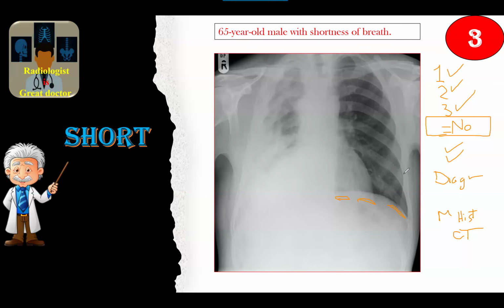Very good, Yunus. The CT remaining discussion. You described very well reduced volume of the right hemithorax with nodular pleural thickening circumferentially encasing the right lung, associated with signs of volume loss such as rib crowding, elevation, or absent or silhouetting of the hemidiaphragm and the right cardiac border and angle. No calcified pleural plaques could be seen on the left lung.